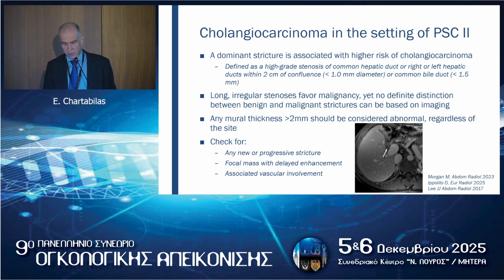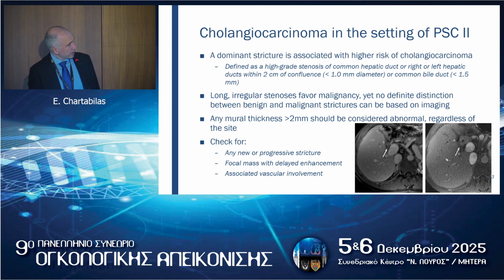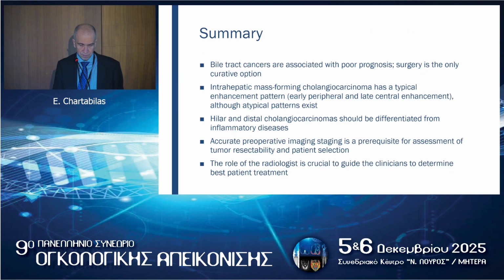This is an example from the literature. You see here the initial diagnosis of PSC, and this is just 1 year later where you see this mass-forming thickening of the duct.